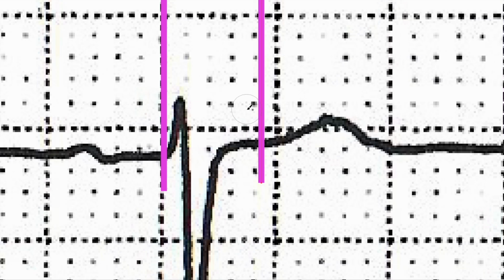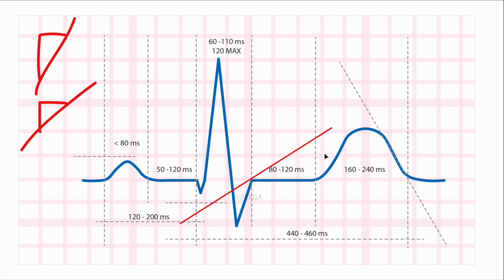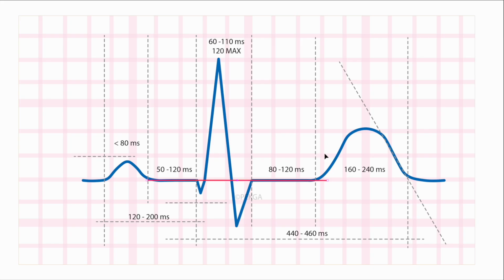So going back to the ECG, I'm sorry, let me just tidy this up here. We might come back to it. I don't want to run into a mess. Okay. Oh, that's a lot of deleting. All right.